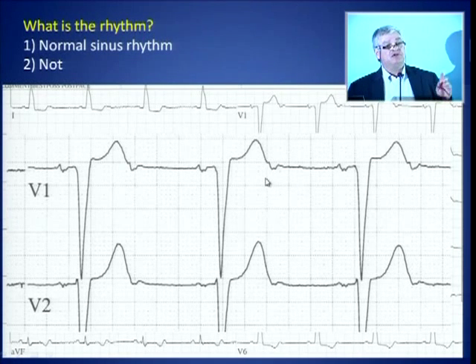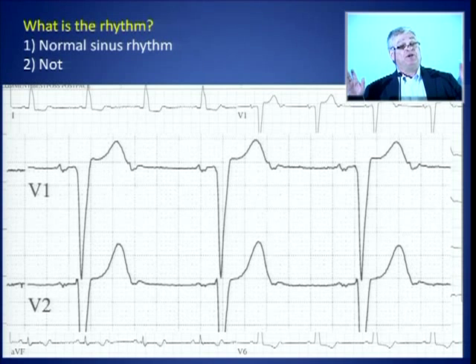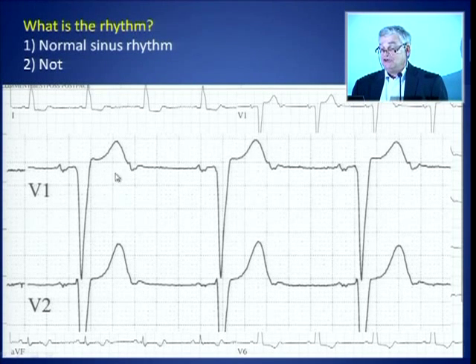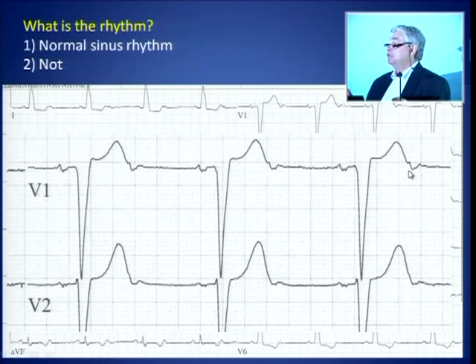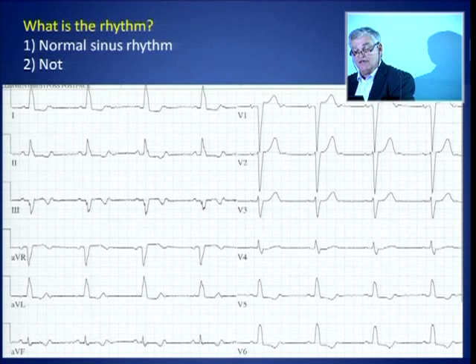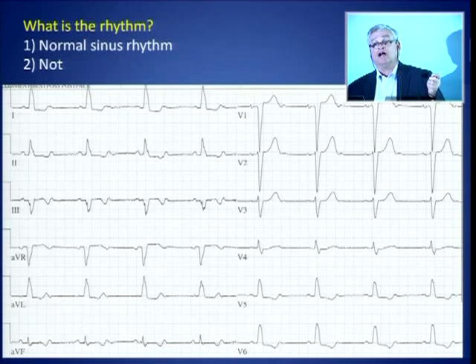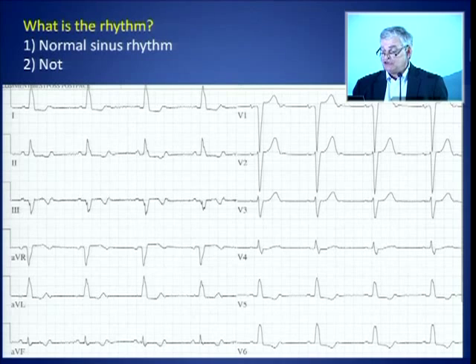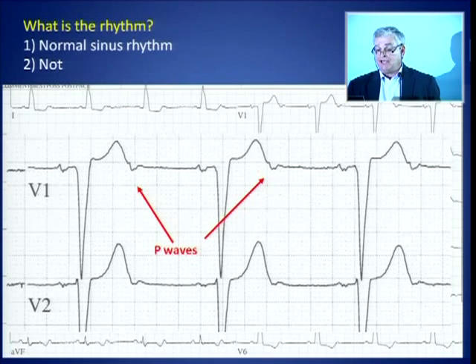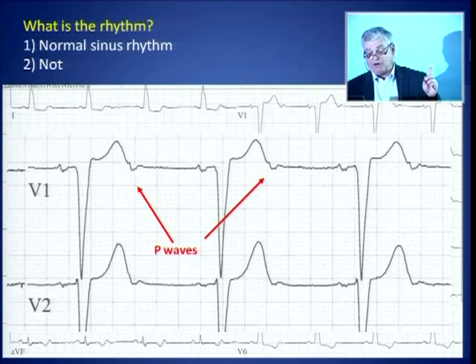High frequency is not repolarization, it is depolarization, or it's artifact. But I can tell that it can't be artifact here because there's one at the end of every T wave. So this is 2-to-1 block that wouldn't have been recognized easily. Who, when they first saw that, realized that that was sinus rhythm with 2-to-1 block? But now you're going to get it because you're going to look and you're going to see that. And as soon as you see that high frequency deflection, that can only be a P wave. That can never be part of the T wave.